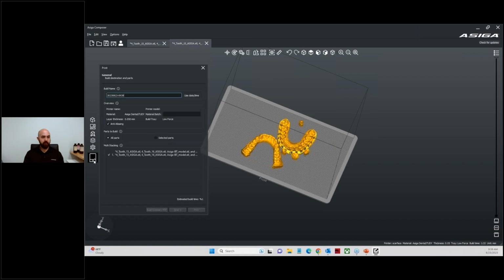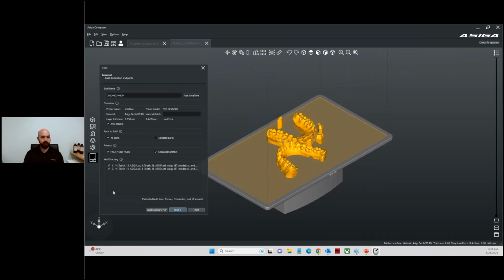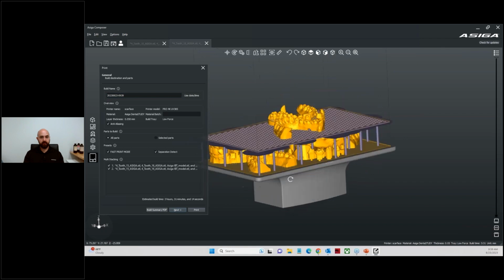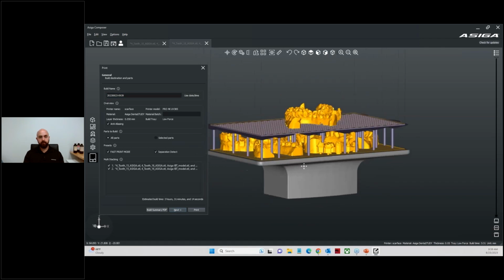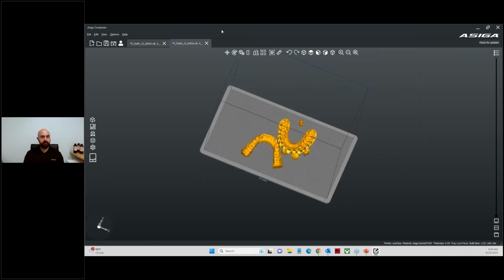All right. And now under the build wizard, we have the multi-stacking feature, and it will automatically stack the build for you. Pretty cool feature. All right, I'm going to go ahead and close out of this. This actually concludes the tutorial over Composer 2.0.